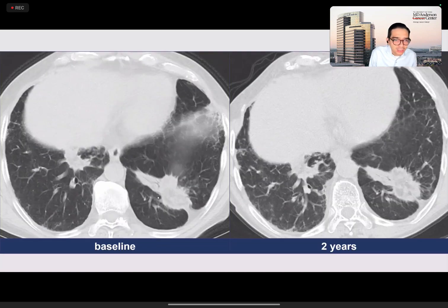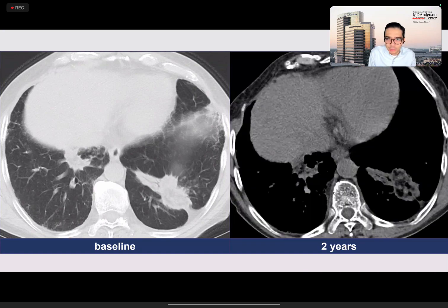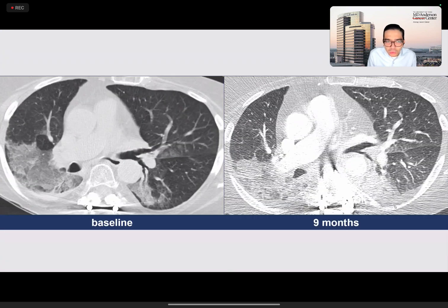And here's another example. In this patient, you can see it's very spiculated. So initially the practitioners and the clinicians thought that this was a lung cancer, and rightfully so, because it looks very spiculated. But fortunately, it was benign. And this was lipoid pneumonia, which you can see on soft tissue windows. As I mentioned, you don't always have to see the fat. If you have a very good history of mineral oil or castor oil ingestion, and you have these chronic opacities, that is sufficient for you to suggest the diagnosis.